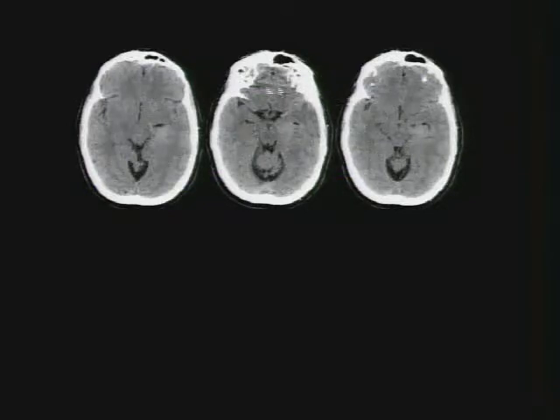Here's a gentleman who presented to UCSF Medical ER with a seizure. Here's a CT done, and I think everybody in this audience probably could see that there is an abnormality, asymmetric high density in the left temporal lobe. But you really cannot do much with this. You could say, well, there could be some hemorrhage that's resolving, maybe there's a mass, maybe not.